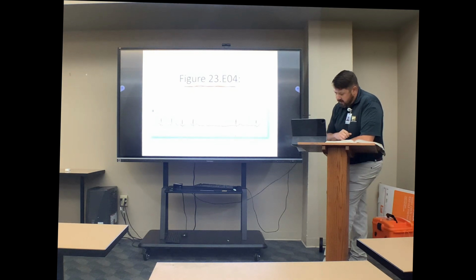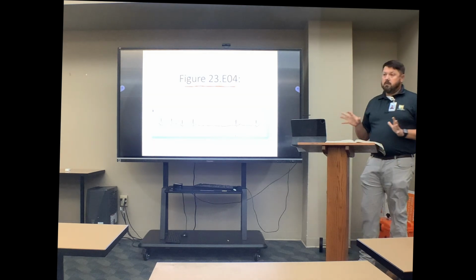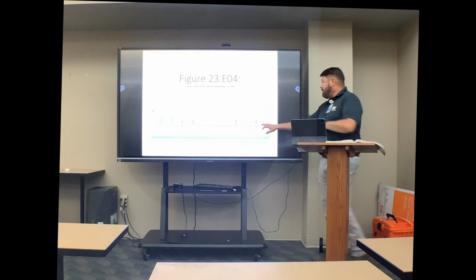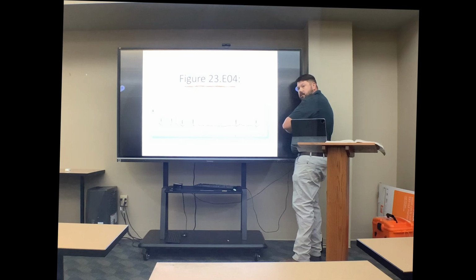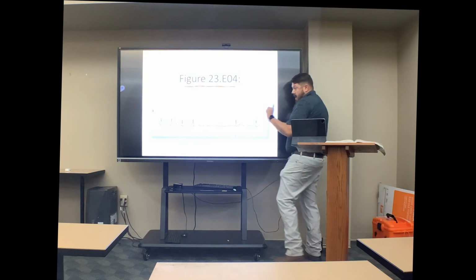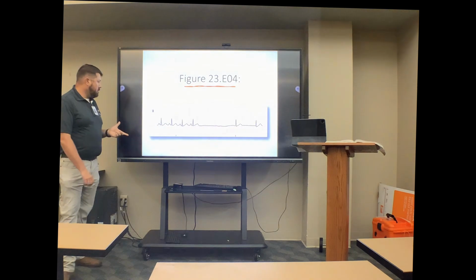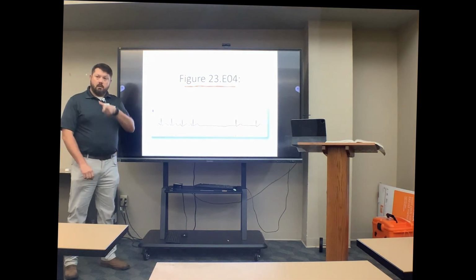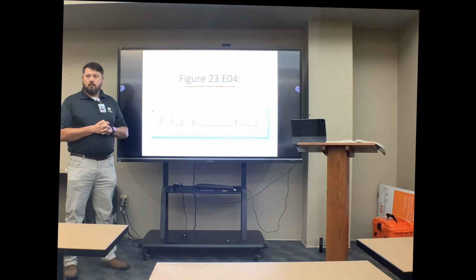This one actually would be a sinus. This is actually paroxysmal. If I were to see more of this, I would actually probably see that now I'm going into a junctional escape rhythm. All right, so what happened here? Well, somebody explain to me, what do you think happened here? I think the SA node was over pacemaking at the start, and then it switched over to the AV node.